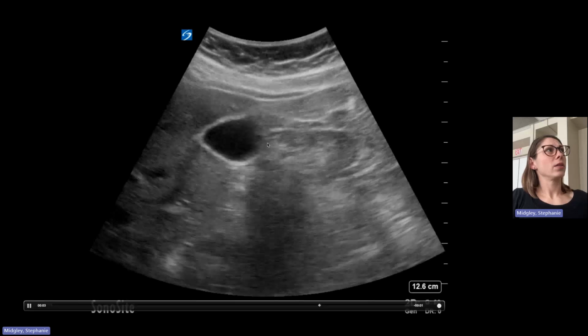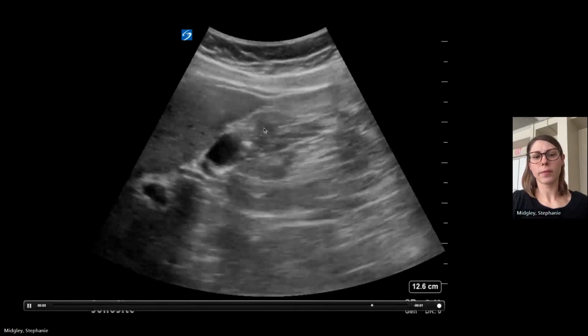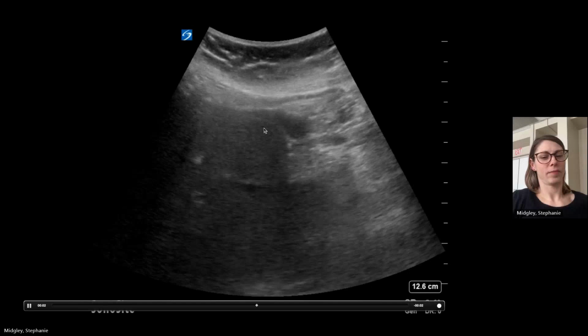Do you know what this thing is called? And is that pathologic or normal? That's not. Good. What is it? I know what it is. Yeah. What the actual name for it is. Ah, that thing with the little. Yep. Yes, the phrygian cap.